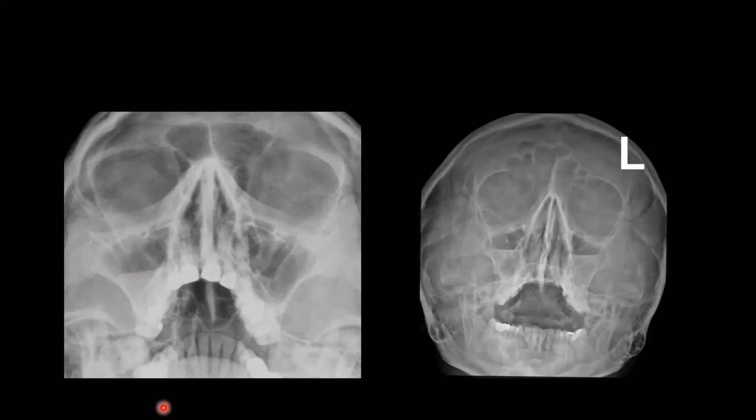And in this patient who was also having similar issues, but on both sides, both cheeks were tender. You can see that the frontal sinuses are normally aerated, and you can see the difference in the structure. As I told you in the previous lecture, all patients do not have similar structures. This is also normal, and this is also normal.